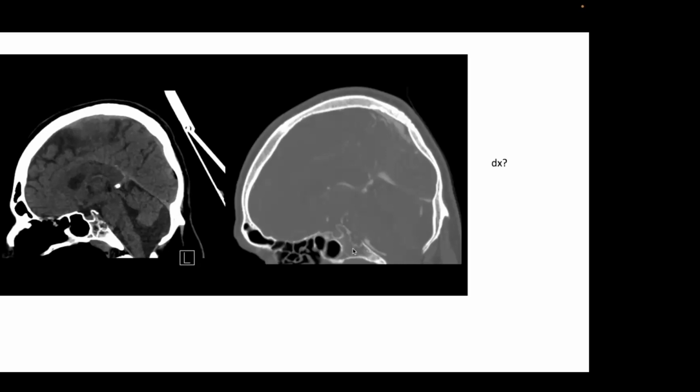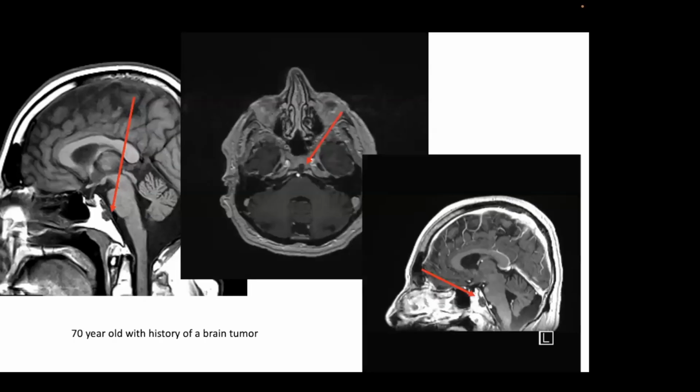Chordoma maybe. Okay, and now we're in the right family. You want to consider the diagnosis of a chordoma, because chordomas occur in this location, in the midline, in the clivus. They frequently destroy bone, though, not remodel it, and they frequently enhance, although not always.